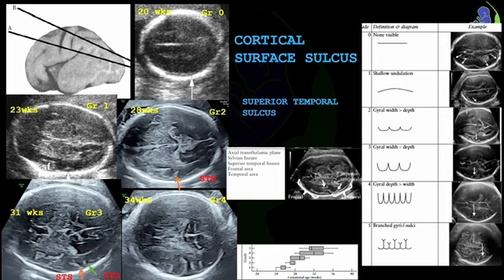The grading of cortical sulci is completely different from what we have seen in deeper sulci such as calcarine, cingulate and POF. Once multiple sulci start appearing, then their depth must be compared with the width, and grading is assigned based on this relationship.